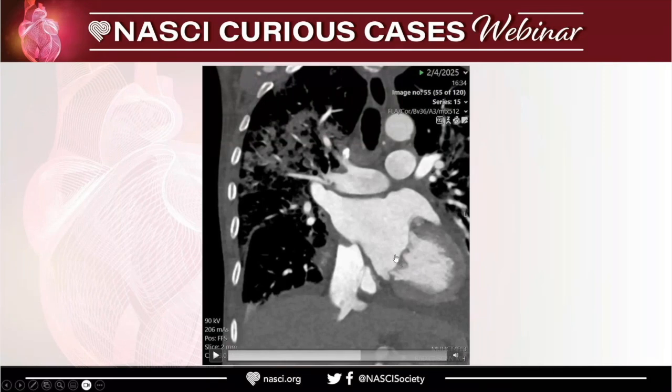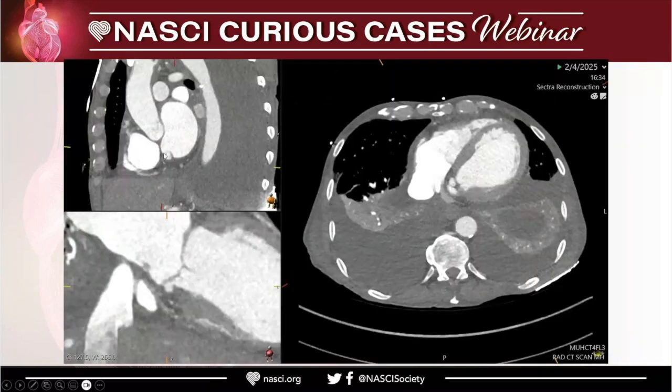This person had mitral vegetation and also aortic vegetation, and then there is this outpouching of contrast, and then we see that hypoattenuation. This outpouching of contrast, we can label as either pseudoaneurysm or abscess. When we see the hypoattenuation, we are pretty sure that there is an abscess. So we have this multiplanar here, and we see that outpouching and some hypoattenuation.